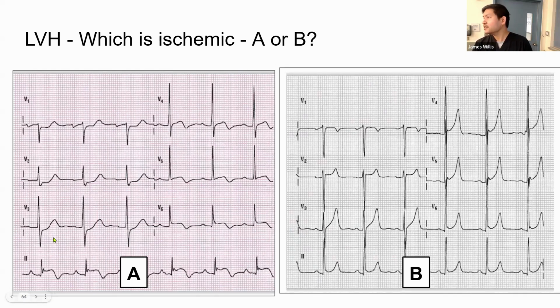A or B? A, what's going on with A? Oh yeah, this one kind of gives you away. The ST elevation is going in the same direction as the QRS complex, so this is by itself very concerning for MI. Here maybe, and a little bit here, but also you have this linear ST depression, also concerning for posterior involvement. So probably posterior lateral, inferior to lead two here.